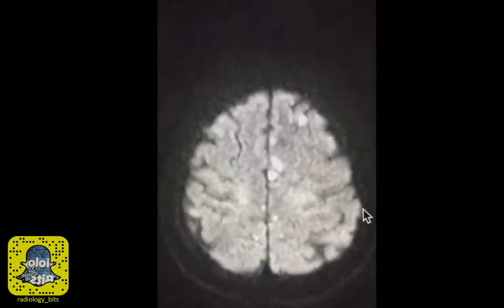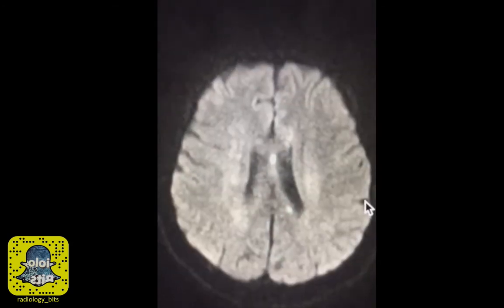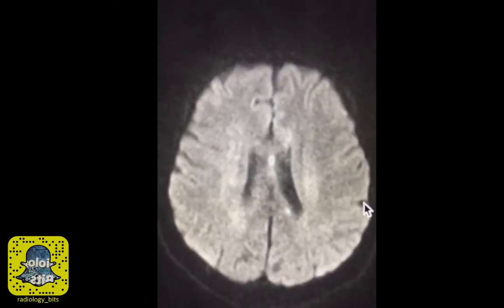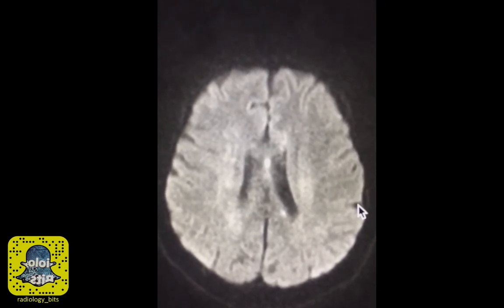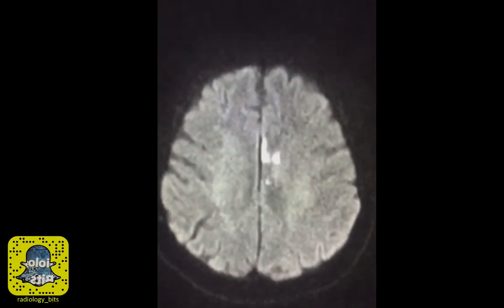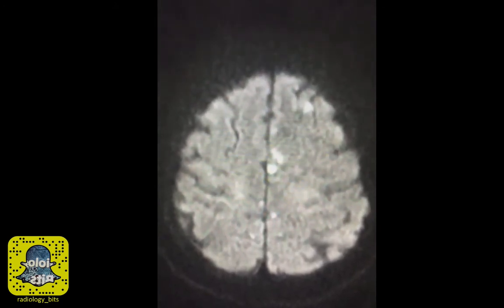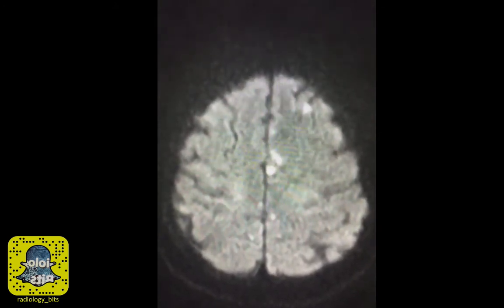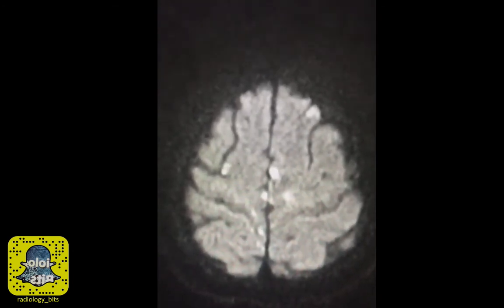Now, the patient's echocardiogram was performed and it showed a normal study. There were no cardiac abnormalities. Things in the heart that you'd like to assess would include atrial fibrillation, thrombi, and a few other conditions. So there was no clear-cut cardiac embolic source. Now keep in mind the multiple tiny, patchy areas of predominantly cortical involvement. When you see something like this, in addition to the cardioembolic theory, you have to think about another condition.